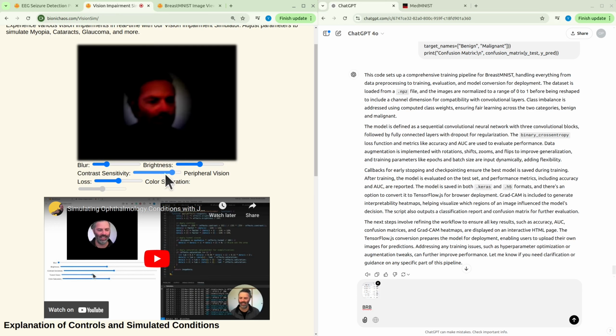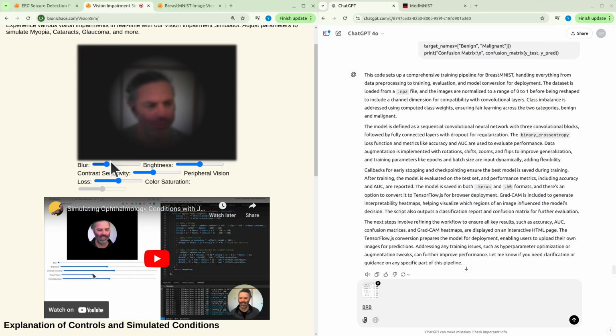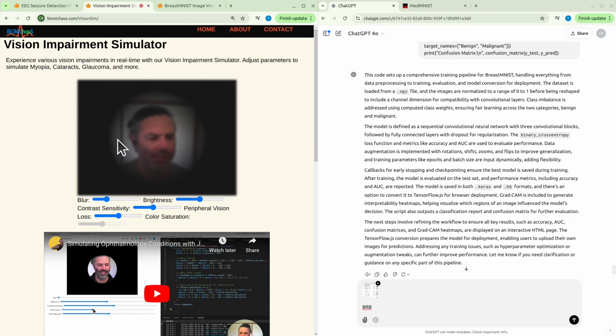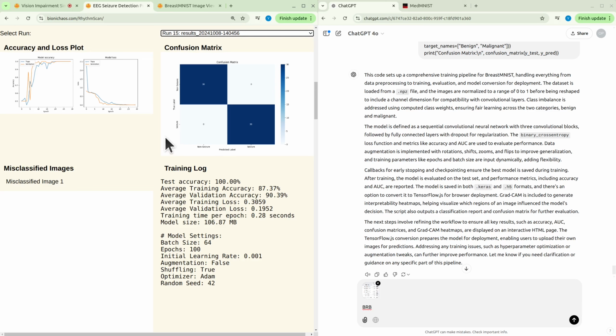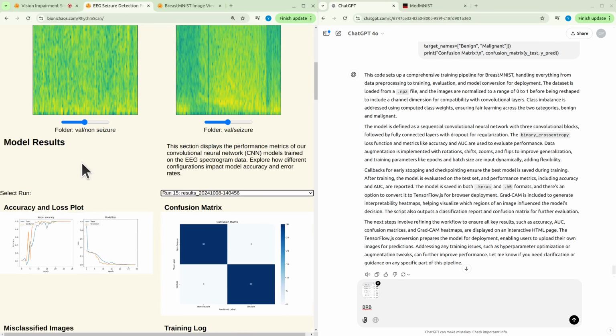This tool is quite heavy as well. The vision impairment simulator is a bit heavy as well. We would like to avoid things like that. I think this is also because it has a Flask backend. We would like to avoid that because I can actually hear my CPU, GPU going when I'm using this. It should work on your end as well, but I think it must be the GPU. Anyway, I'm dealing with different images now, and we'll have a similar display.